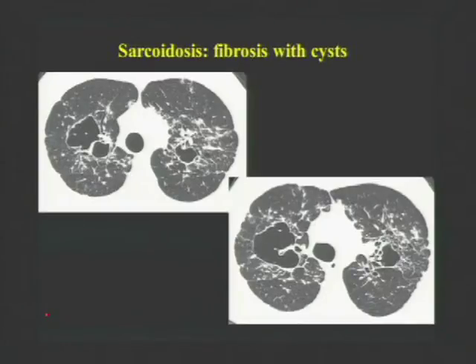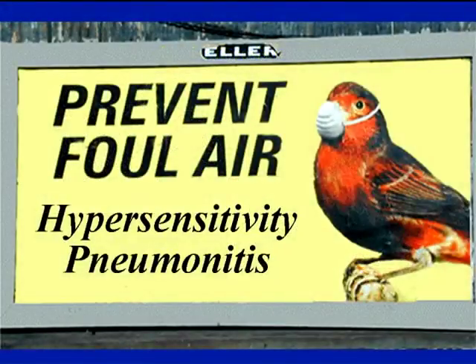Patients with end-stage sarcoid can develop cystic lesions in the upper lobe. Sometimes these represent dilated bronchi, and sometimes they're simply cysts, but this appearance is not uncommon in end-stage sarcoid, and because of these, mycetoma is reasonably common in patients who have end-stage sarcoid with lung fibrosis.